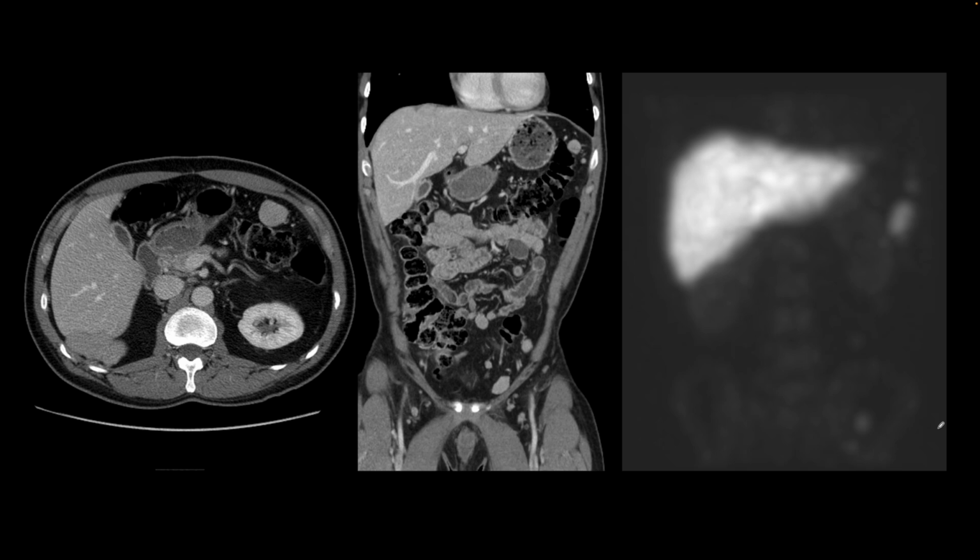This is our next patient. They were suspected of having multiple tumors, enhancing foci on their CT of the abdomen and pelvis. But it was also reported that the spleen is absent and they may have splenules. And so in this situation, you want to do a nuclear medicine sulfur colloid liver and spleen scan to make a diagnosis or rule out a diagnosis of splenosis.